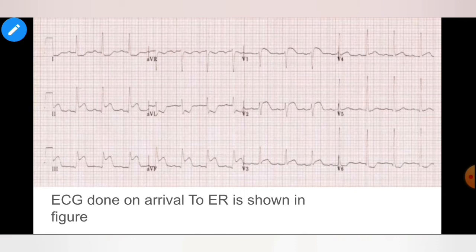So now I will finalize my finding on this EKG strip. Normal sinus rhythm with a rate of 84 beats per minute and regular rate. There is PR prolongation, first degree heart block.